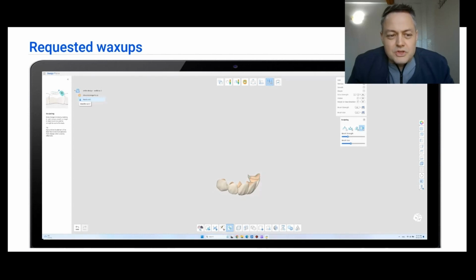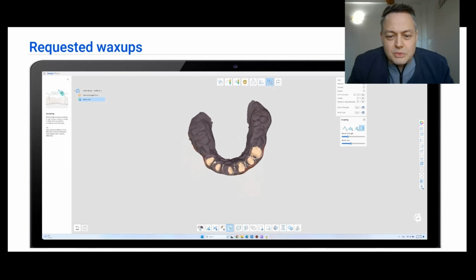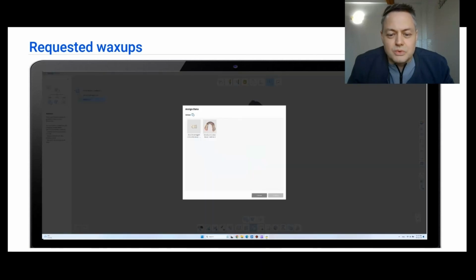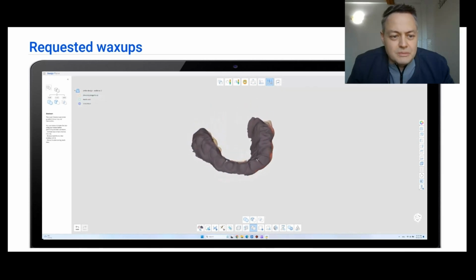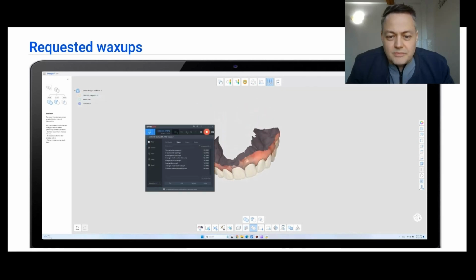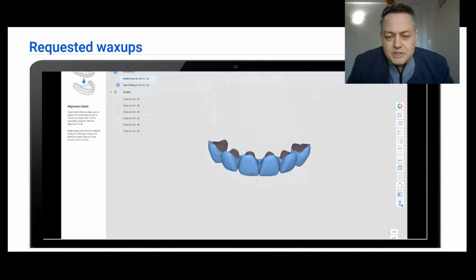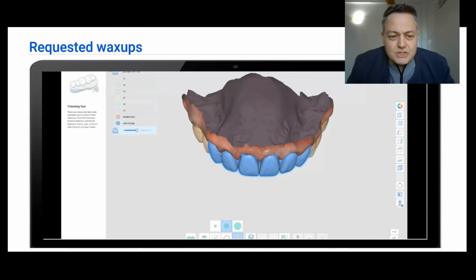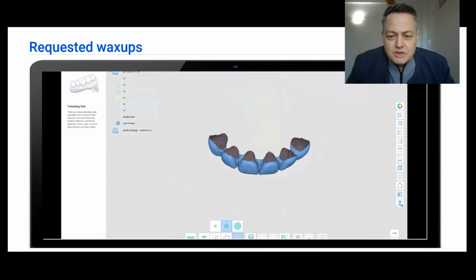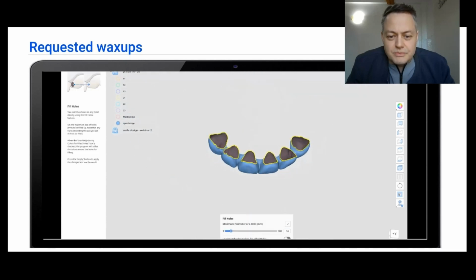And after we just pulled on the model, we can see that we now have intersections, and we'll do the Boolean union, and now everything is going to work just fine. The second way the technician can send you a model is to actually give an open bridge, as you can see here. And if the bridge is open and you want to merge it, the first thing you do, you'll just go and close the bridge with the fill holes function.